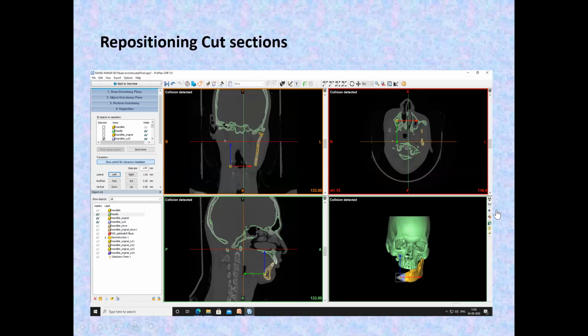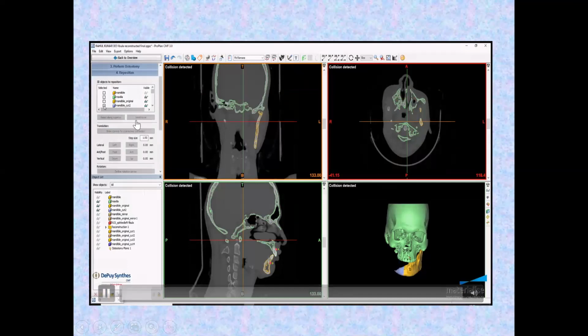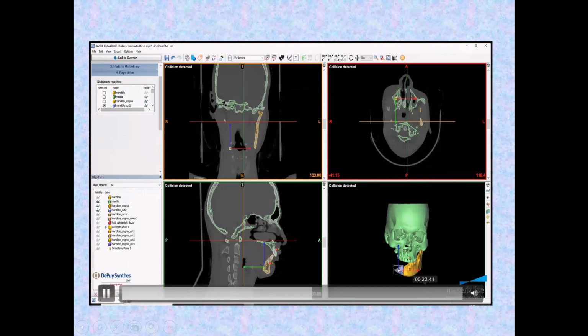For that, I'll show you. This is done like this. And to see whether we have selected the correct part, I'll just check it with the eye visibility button. So I've checked it here and seen that it's the correct part I've selected, and then show control translation, and then we can manually move it with the cursor.